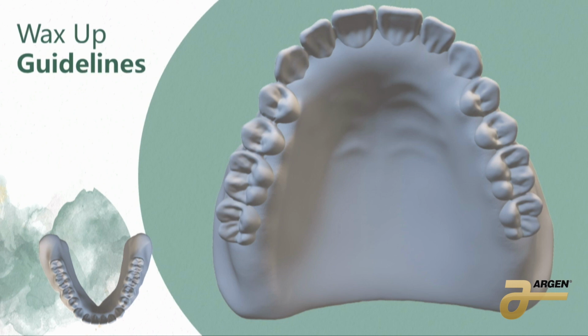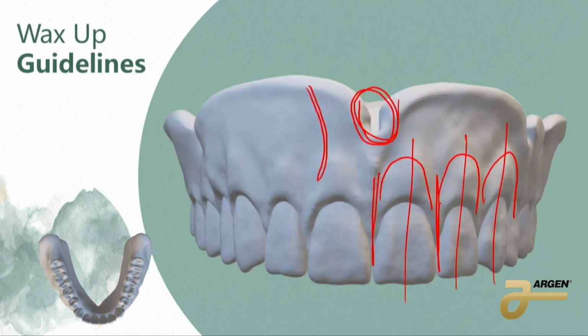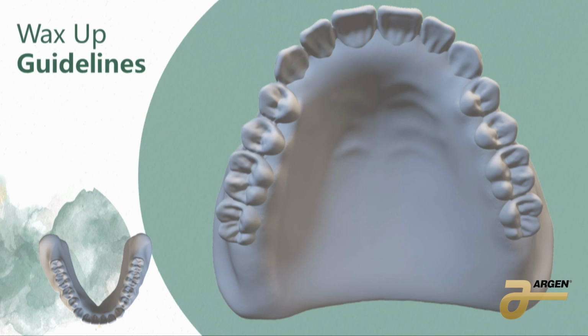So here, from a top view, you can see I have some rugae here. This is honestly rugae. There's no true science anywhere that really says if it's good or bad. It's okay either way. Some patients like it, some patients hate it, some dentists want it on every single case. There's nothing wrong with it.